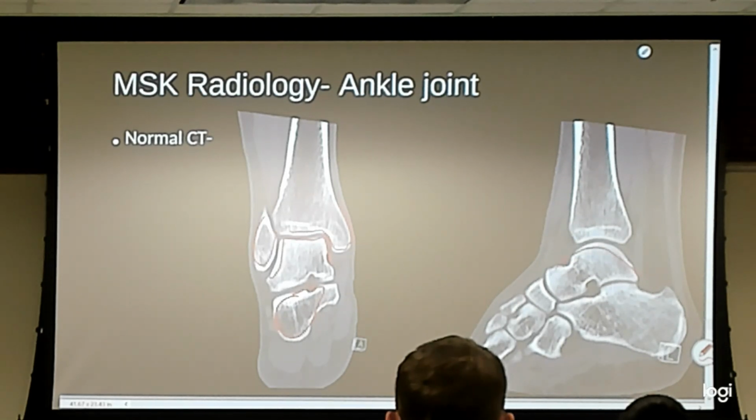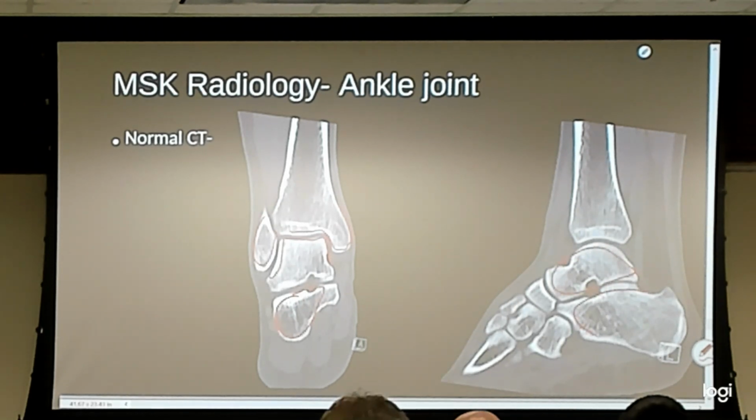And here we've got talus, calcaneus, and this is actually a little bit better. So this is before you get to the lip, but there's that posterior malleolus again, if I were looking for a trimalleolar fracture. One moment, drew a lot of lines.